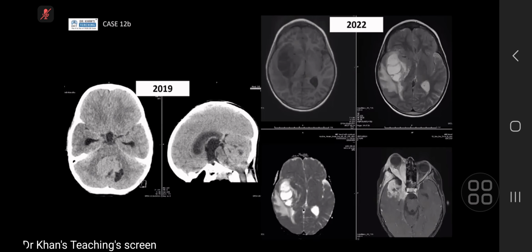The others do have metastases down the CSF, so like neuromets, but then it's just an interesting case because you should take note of the timeline. So if you hadn't gotten that this was some sort of brain tumor, because I think it looks fairly aggressive, right? Because you've got your hydrocephalus there as well. And again, posterior fossa, you would think brain tumors first.